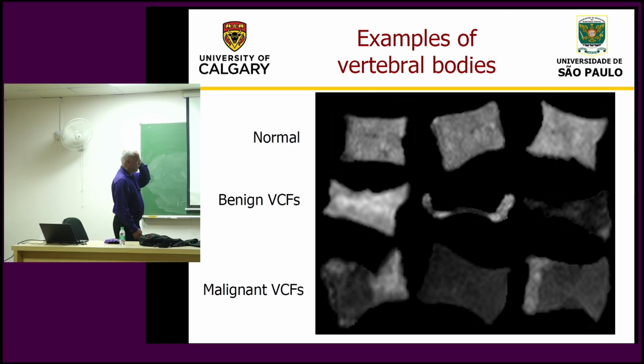So here are some examples. This is how we typically start our projects. Get a number of these examples of different categories and sit and look at them and try to understand what is happening, what are the distinguishing characteristics, what are the confounding factors.